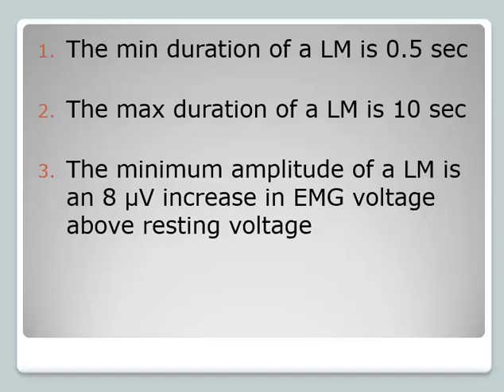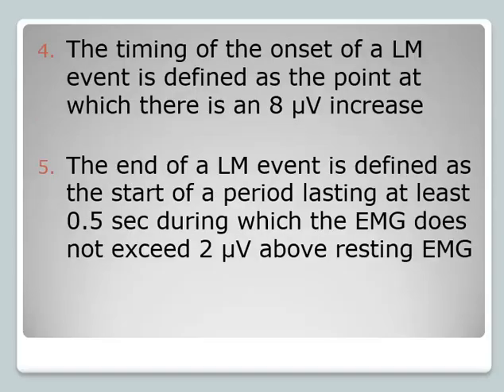That wouldn't count. And then the timing of it: just like with the arousals, it's not so important to spend time clicking and dragging the entire event, but it is important to try to time the beginning of the event. So that's the point at which there was that 8 microvolt increase. And then the end of the event is the period where your leg muscle tone returns back to resting EMG or is within 2 microvolts above resting EMG.